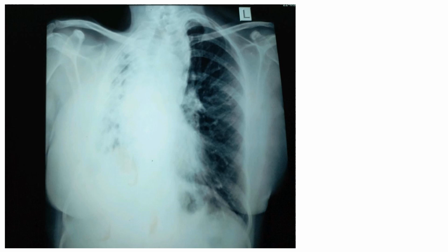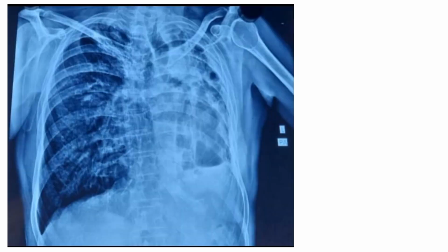This X-ray, see the right side, it's almost destroyed. Left lung is larger. The trachea is shifted to this side. This is the diaphragm end. It's coming up. So there's a right side volume loss. I'm going to be fast because we have already spent a lot of time in this session. So here the right lung is large, left lung is destroyed, some cystic spaces are there, and here you have the trachea shifted to the side, the diaphragm is elevated, and kind of herniation of the lung is also seen.